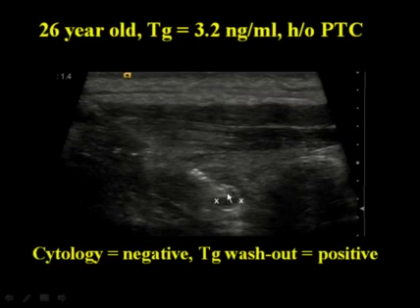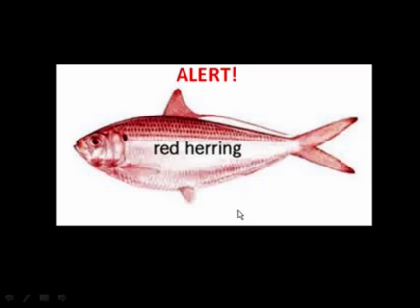You can biopsy these lesions. It was a tiny lesion, just a few millimeters. We did not get positive cytology on this from the FNA. However, we routinely send the washout of these FNAs. So we'll spread the FNA specimen on a slide, and then we'll rinse the needle tip in 1 to 2 cc's of saline and send it out to the lab for thyroglobulin analysis. In this case, the thyroglobulin was positive. The patient had received prior radioactive iodine, so she's unlikely to have any normal thyroid tissue, and this was recurrent thyroid cancer in the thyroid bed.